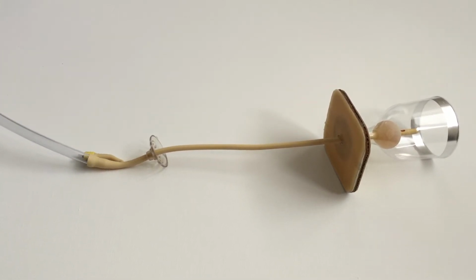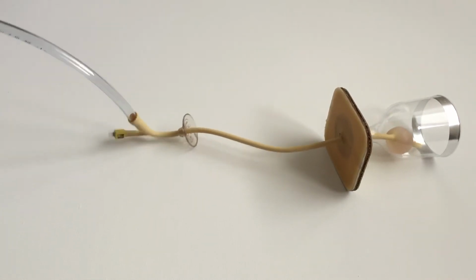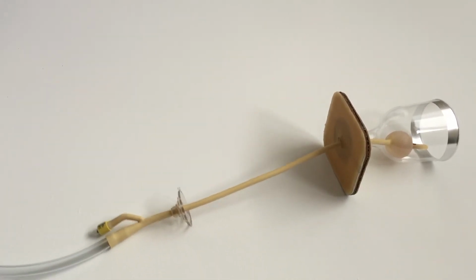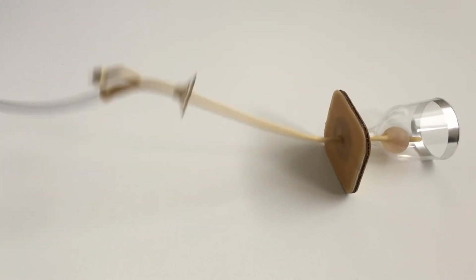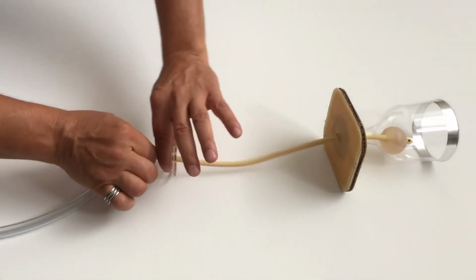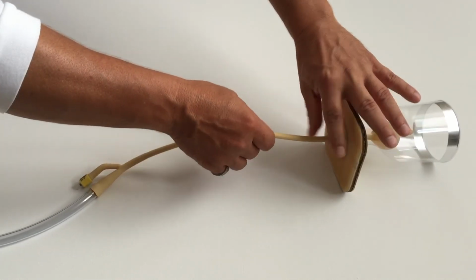For the first part of this demonstration, just ignore the SupraCath disc and notice that using the urethral or Foley cath alone, anytime the catheter or the catheter's tubing is moved or repositioned, so does the catheter within the body. This movement places minute amounts of forces up the tubing and the indwelling cath and its balloon, and consequently makes the catheter as a whole inevitably dislodge and fall out of its correct and proper positioning.